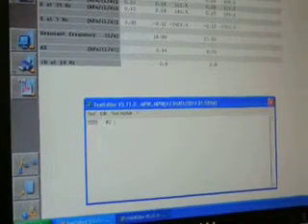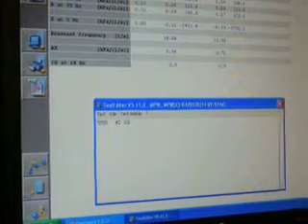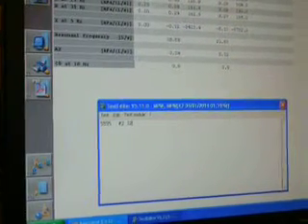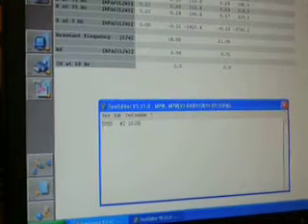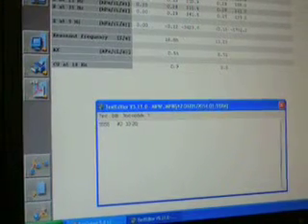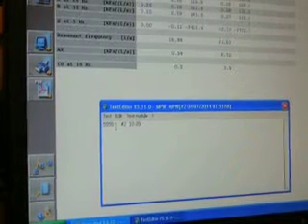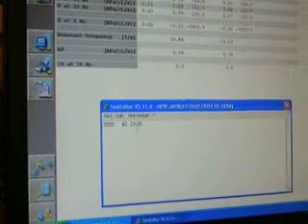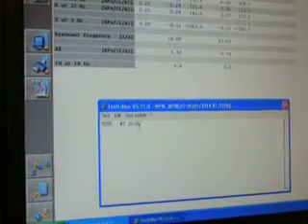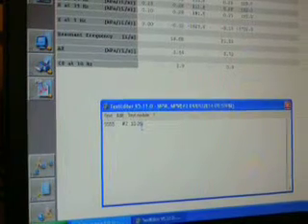So that one that we edited was 10 seconds to 26 seconds. The reason for this, I always want to have your ID number in the comment section. And then if you edited one, I would need to know which one you edited and what section you chose, so when I overread it, I can reproduce that value.